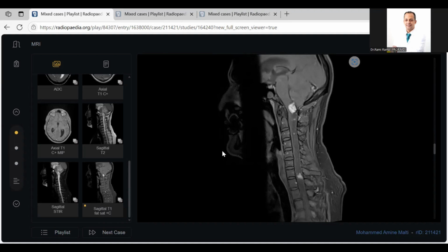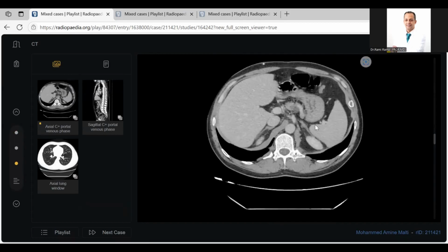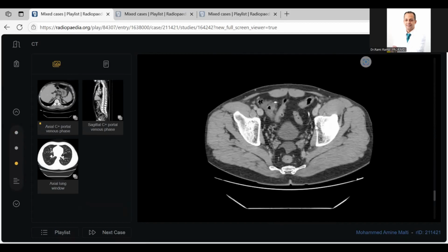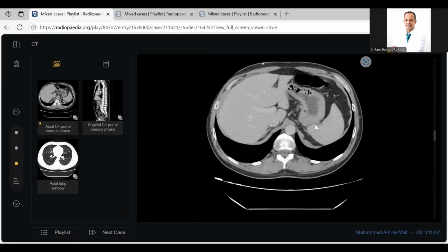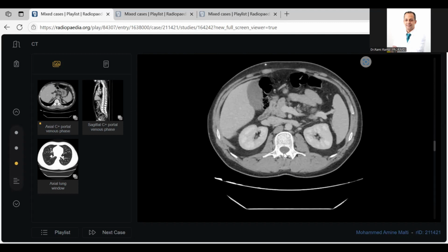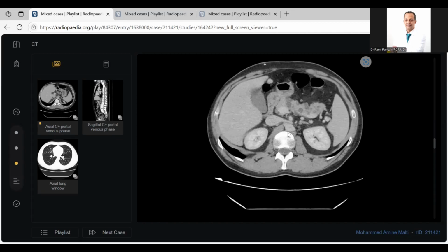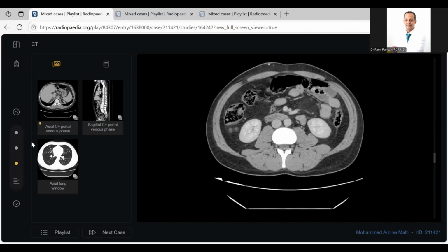You are more than brilliant. You picked up a very difficult, long case scenario. Even though I helped you in the beginning, it is really very difficult. See, my colleagues, the key of this case here in the periphery, in this slide: VP shunt, ventriculoperitoneal shunt, and a hyper-enhancing intraspinal lesion, plus multiple innumerable pancreatic cysts and calcification. Von Hippel-Lindau is the first differential diagnosis.